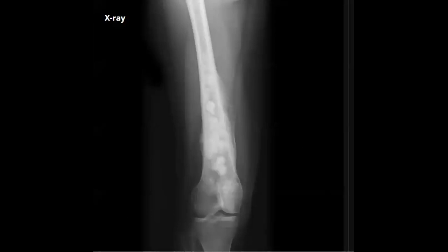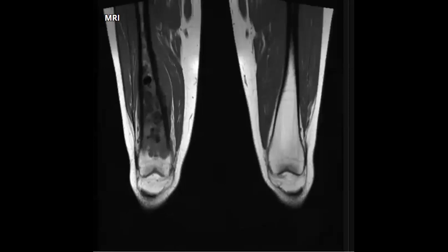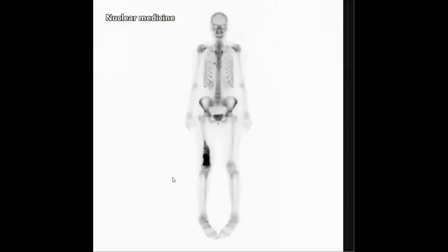It can be osteosarcoma. You think? Yes, this is osteosarcoma. And again, here in the bone scan, you have an advantage. In the bone scan, especially in osteosarcoma, you know that it can have something called skip lesions. Do you know what skip lesions are? Anyone know? Yes, it can have multifocal lesions. So in this case, you prove that this case has one osteosarcoma.